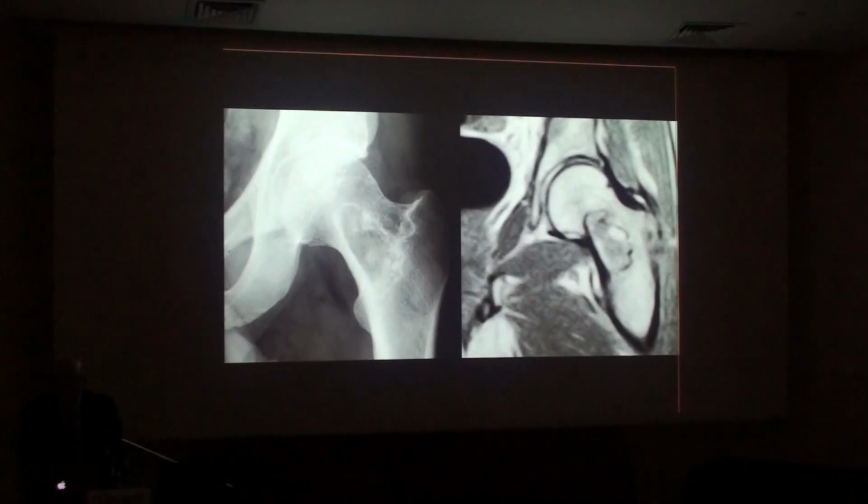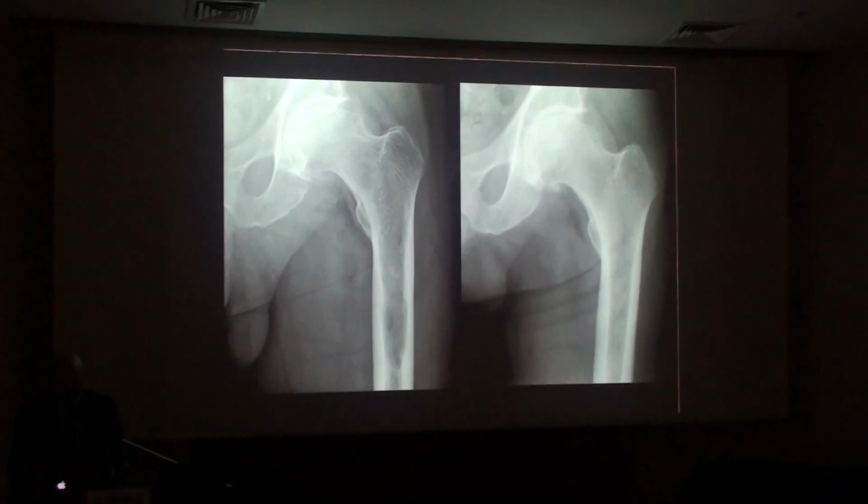And here, on the T1 weighted image, you can see the fat, but you might say, hey, wait a minute, that fat is awful dirty in the middle. Why is that? Well, that's the areas of involutional change where that fat will change its signal intensity, again, secondary to mineralization, calcification, ossification, as well as cyst formation.